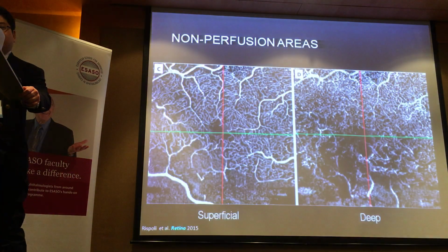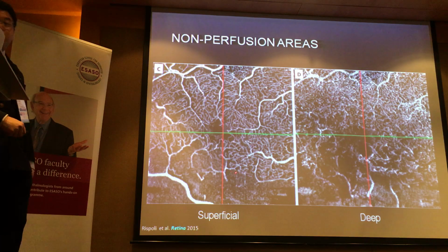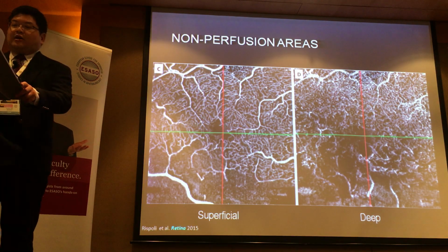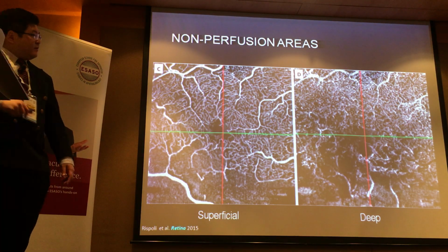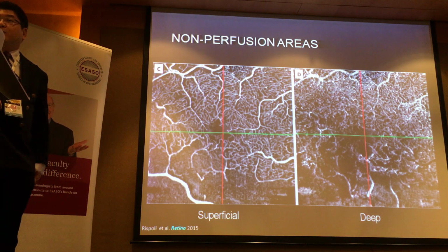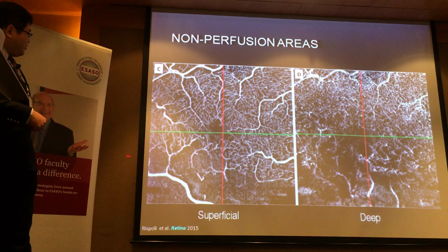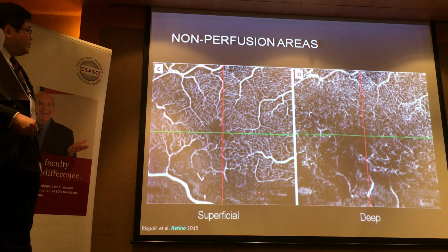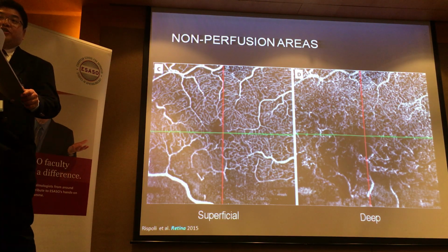How about retinal vein occlusions? Well, again, you can see very nicely the superficial and the deep. This is a branch retinal vein occlusion. Look at the areas of capillary dropout inferiorly, all right, and also look at the vessels, how clearly they are seen, right. So this is obviously quite good, but remember, if you're thinking of doing a laser because you want to assess how much ischemia there is, realize that you don't know how far this extends on this edge or here, and for all you know, there could be some area up there that's another branch that's included as well.